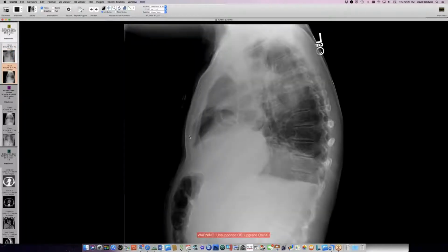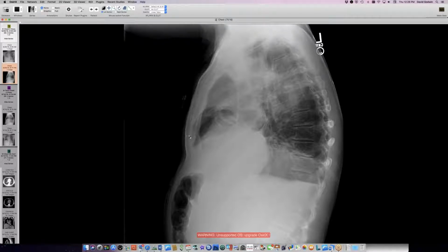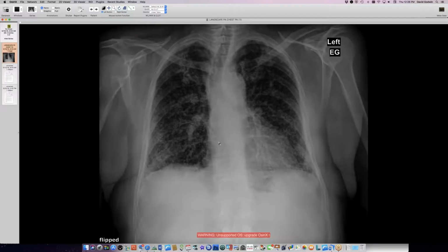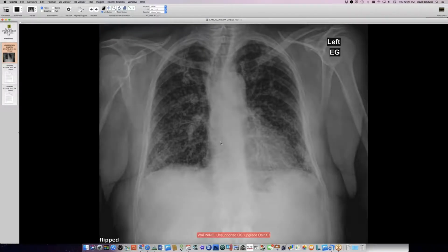So as for the zygomycete, I'll give you the species name when I post the case. But a very nice bird's nest pattern. That bird's nest sign really holds up pretty well in strongly suggesting a mucor rather than aspergillus.